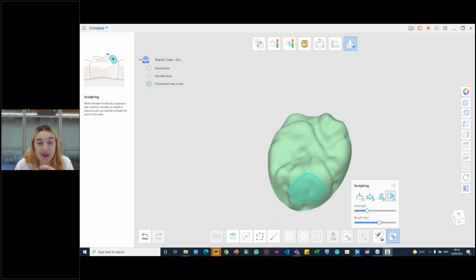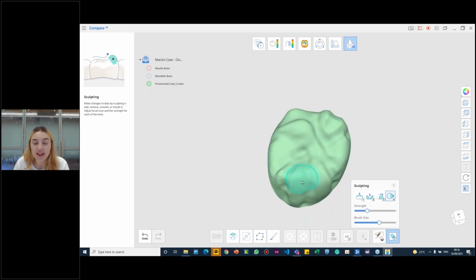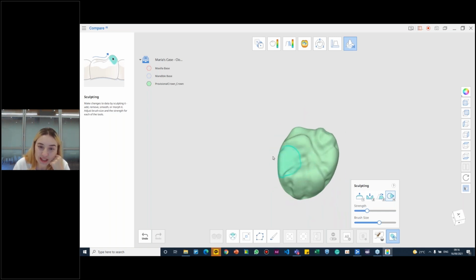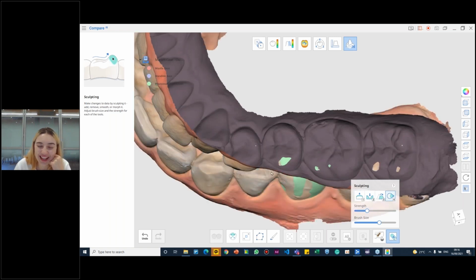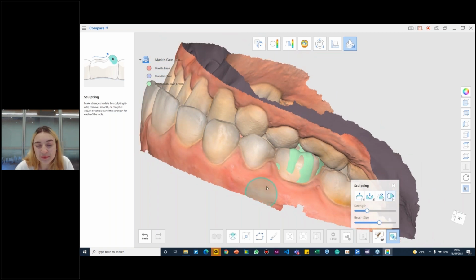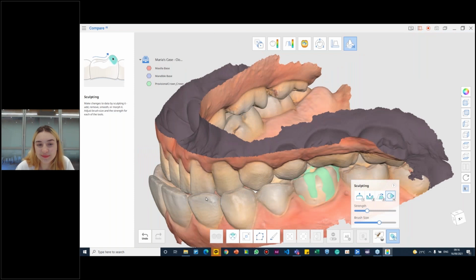I'm not a lab technician, and I'm definitely not somebody with a good sense of design, so forgive me for this, but this is I think what my crown would look like. And you're doing a great job. I'm just impressed, for somebody who's not a designer or a lab technician. It helps us understand really well how this could work in a clinical setting.